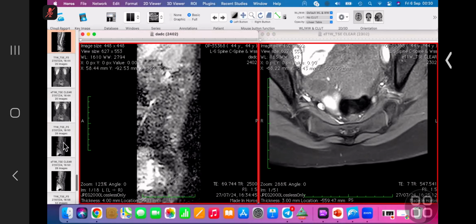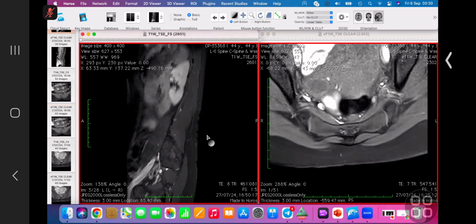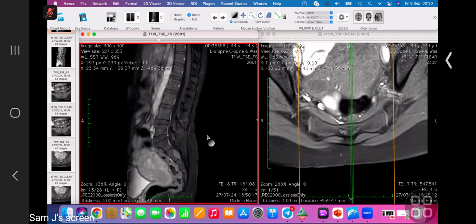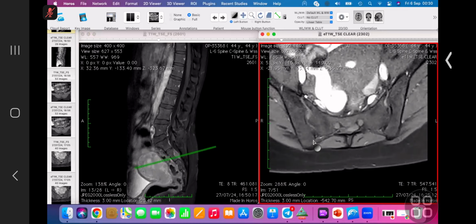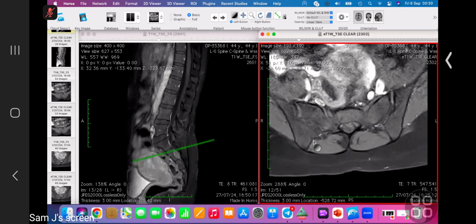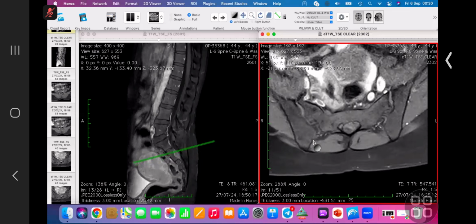Interesting. Yeah, that's the post contrast, a sagittal post contrast. I can see that the mass lesion showed homogeneous enhancement in the post contrast images, and in the axial images it looks like it's extending into the left neural foramina, and also shifts and displaces the spinal cord to the right posterior corner, causing compression.